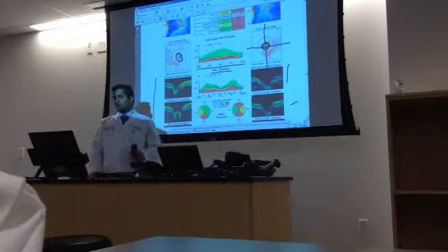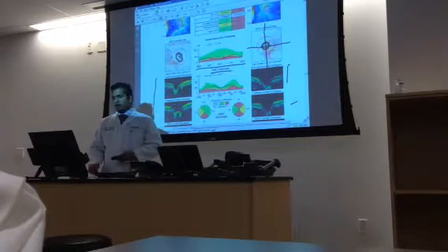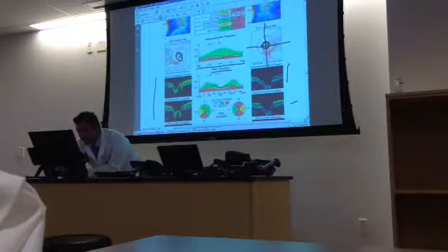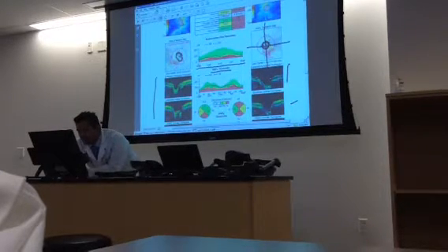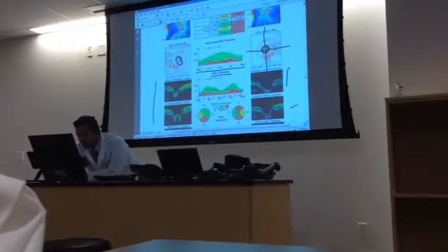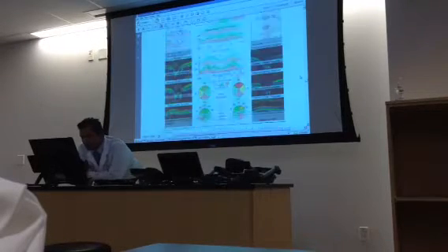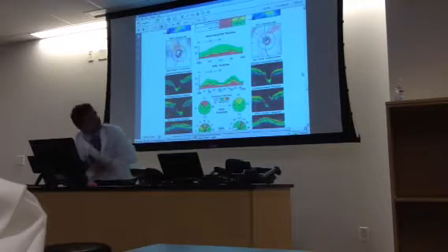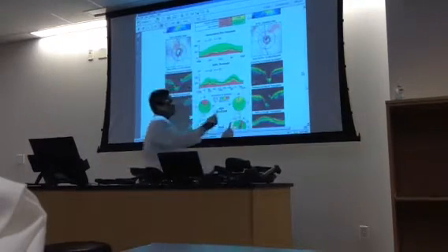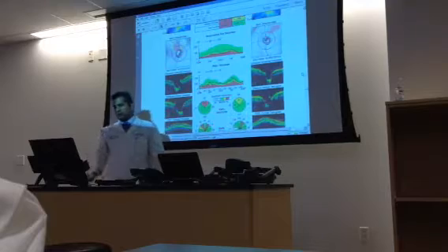But once in a while, you find artifacts of imaging telling you what's going on. So if you look carefully, this red line goes all the way to the border and the bottom of the cup. You see the red line there? That tells you the disc margin, and that's how deep the cup is. But sometimes you find imaging artifacts are going to be flagged. For example, can you see this particular scan? Look on your computers, how this red line does not follow all the way to the bottom of the cup. It's sort of in between, hanging there.